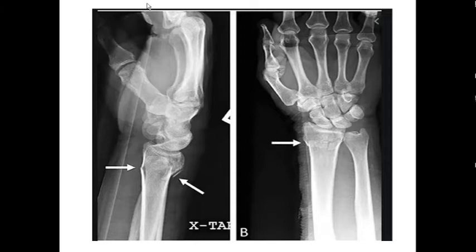You have the option of unmuting yourself and answering the question. Anyone who wants to try can unmute themselves and answer. The fracture is of the radius at its corticocancellous junction. Okay, very good. Fracture of the distal end of radius at the corticocancellous junction, which is roughly around 2 centimeters or 1 inch from the articular surface.